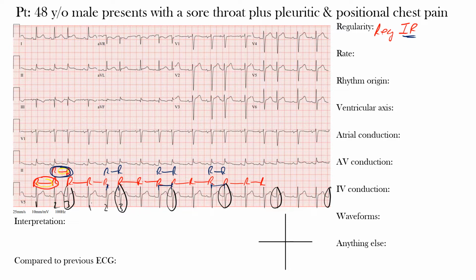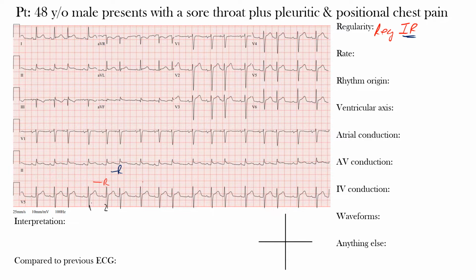Well, this is an irregular rhythm, so we can simply count the ventricular complexes going across the EKG and then multiply that number by 6, because we know that the standard ECG represents 10 seconds. Okay, so let's just erase this so that this is clear. The standard ECG, which you should know from the beginning all the way to the end, represents 10 seconds, okay? And if you multiply 10 seconds by 6, that's 60 seconds, which is the same thing as 1 minute.